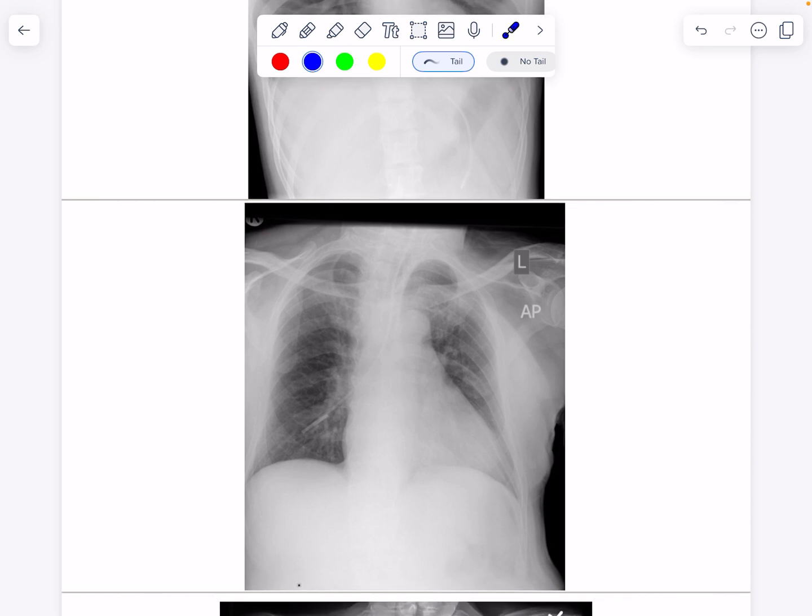Okay, have a pause, see if you can work it out. This is what I mean: this says AP view here. And have a look at the lung size as well, the way that the lungs are squashed and a bit wider. The issue here is, again, an NG tube coming down there. This is not in the right position. This NG tube has gone into the right lung.